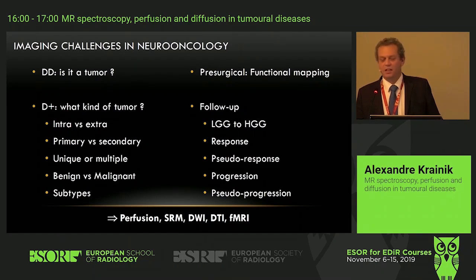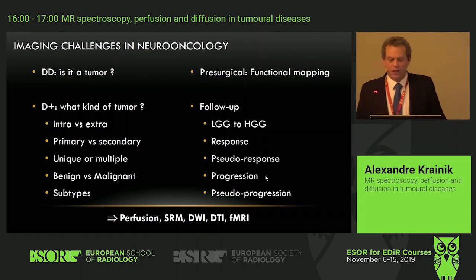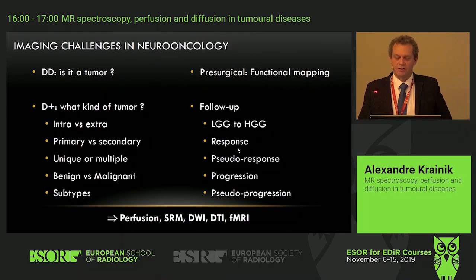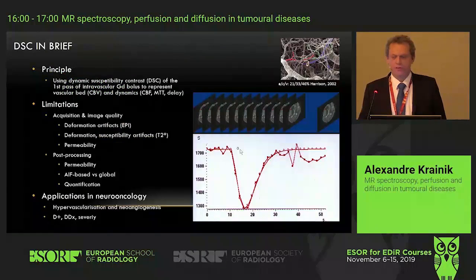And then those techniques, spectroscopy, diffusion, perfusion imaging, are going to help you to better recognize the real events from pseudo events. Then first, we'll start with perfusion imaging. You know the principle we'll use. I will only focus on dynamic susceptibility contrast.